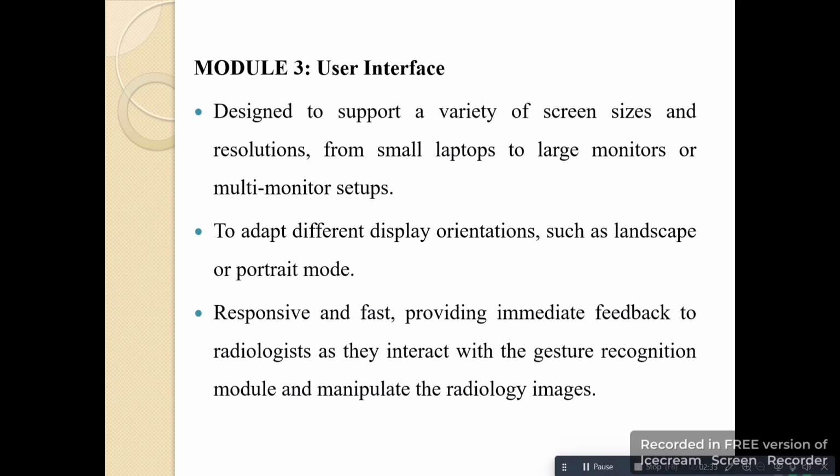Module 3, user interface, designed to support a variety of screen sizes and resolutions, from small laptops or large monitors or multi-monitor setups, to adapt to different display orientations such as landscape or portrait mode. Responsive and fast, providing immediate feedback to radiologists as they interact with the gesture recognition module and manipulate the radiology images.